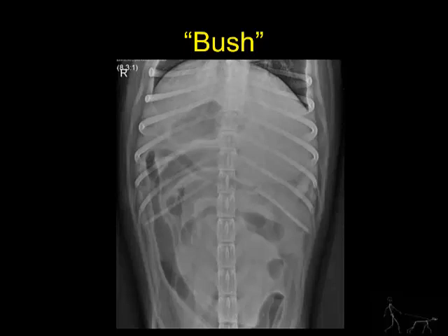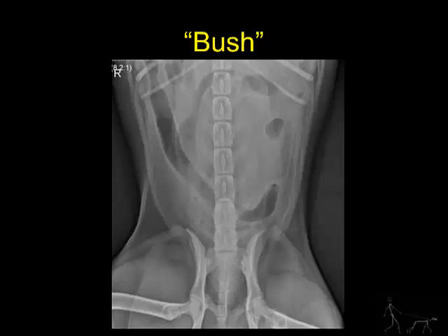Because the entire abdomen would not fit on a single film, both a cranial and caudal VD view of the abdomen was obtained. On the cranial image, the stomach remains moderately dilated with gas, as well as numerous small bowel loops remain moderately dilated with both gas and fluid. In the caudal abdomen, again, numerous small bowel loops are present.